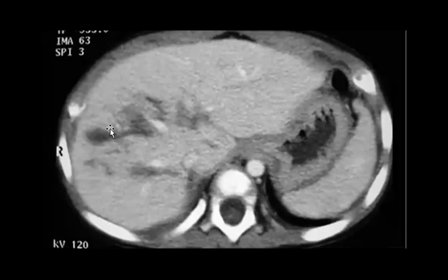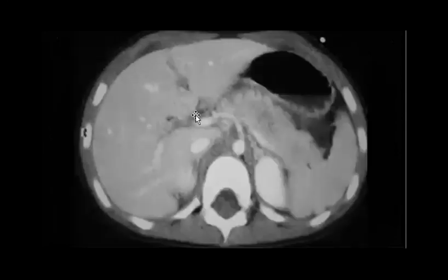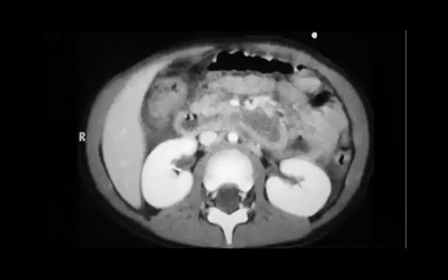Perfect. And here you can find the pancreatic swelling. And if there is trauma, it will be pancreatic edema and contusion. And finally, they like it in the MCQ, what you can find: duodenal hematoma. Duodenal, perfect, duodenal injury. How do you know this? Because it is dilated and full of fluid, right? And you can see thick wall. There is some thickening, yeah, in the wall.